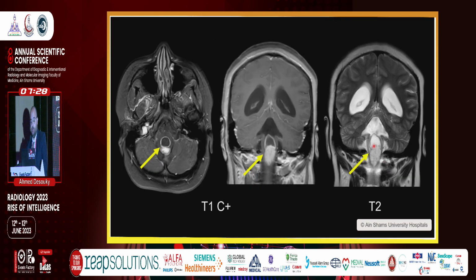So what we see here, and the most interesting note, is back to the flow chart. To diagnose pilocytic astrocytoma, we mentioned that the location is cerebellar hemispheres, but here it is not in the cerebellar hemispheres, it's basically in the medulla. So variations happen. And this is the highlight of this case.